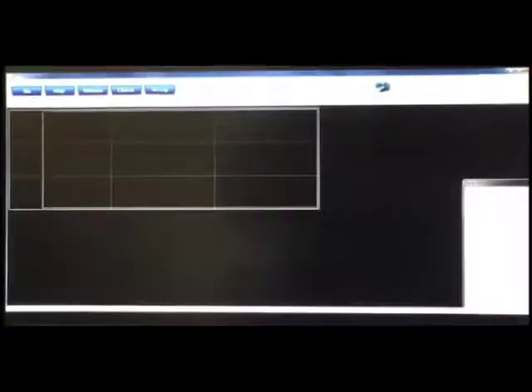If I click this box right here, it allows me to shrink and condense the display once again as I see fit. When I unclick Show Outlines, as you can see, we now have that graph showing in the exact same size that we wanted it to be on. So this is a very powerful tool and actually very simple to use.